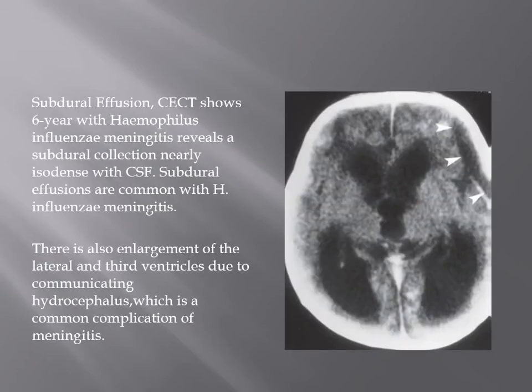Subdural effusion. Contrast enhanced CT shows a subdural collection nearly isodense with CSF in meningitis with Haemophilus influenzae. Subdural effusions are common with Haemophilus meningitis. There is also enlargement of the lateral and third ventricles due to communicating hydrocephalus, which is a common complication of meningitis.